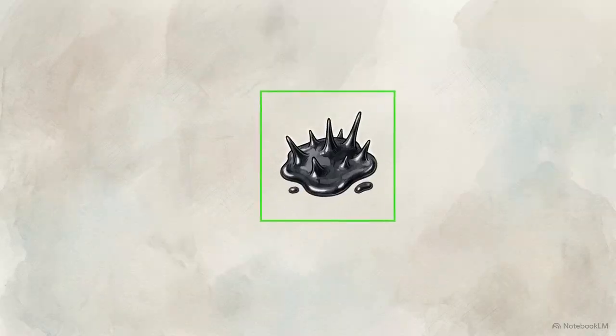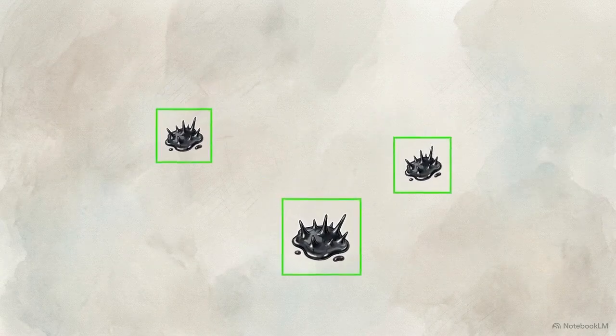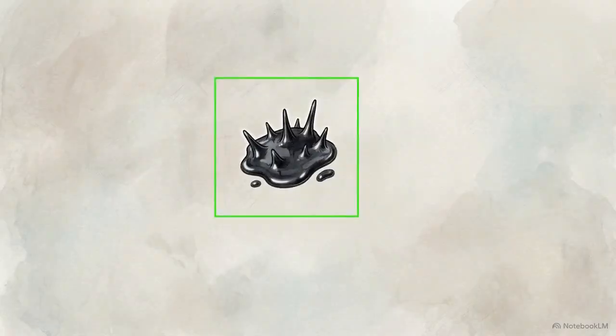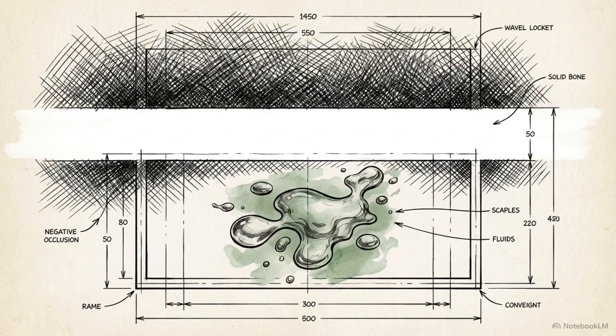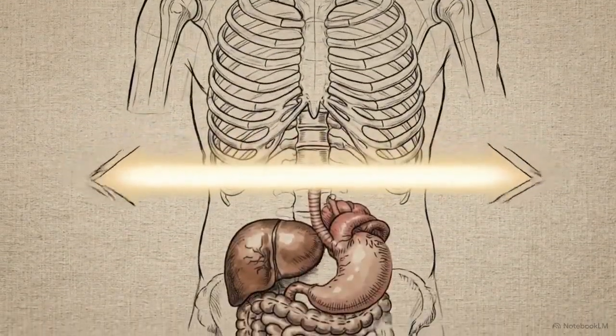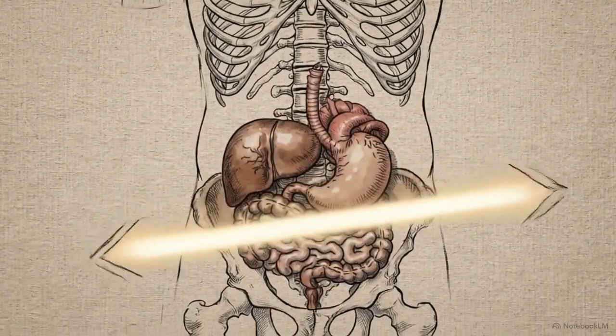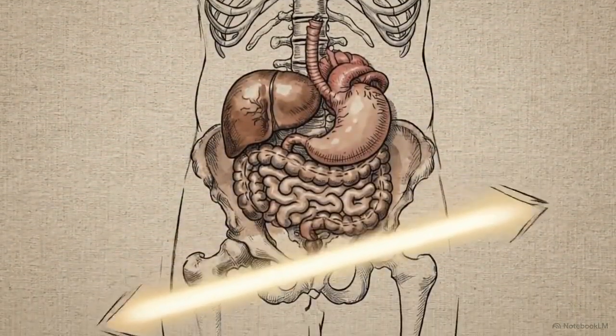Even so, the vision model successfully tracks ferrofluid swarms as they dynamically split into smaller units and recombine. This continuous tracking is maintained even beneath 25 millimeters of solid bone occlusion and severe physiological noise. MicroSyn-X replaces a laborious and error-prone manual process with an automated, precise clinical intervention. Solving perception in complex medical environments ultimately requires computationally generated data that accurately models the physics of both the imaging modality and the anatomical domain.